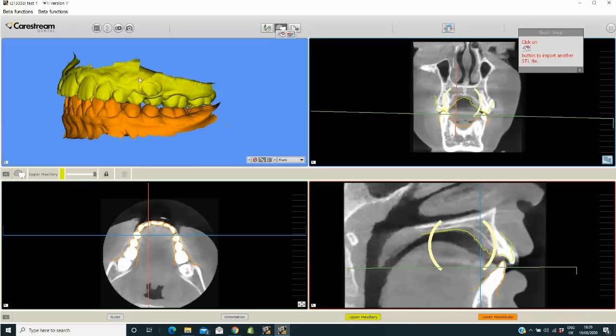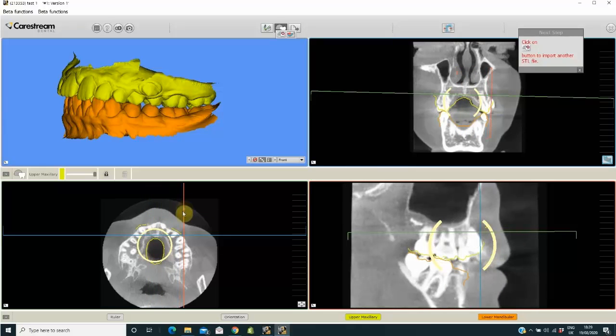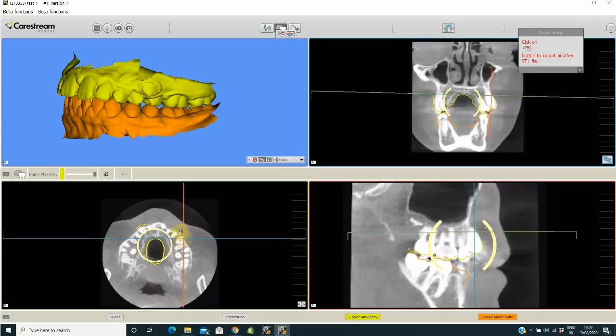When you refer a case to another doctor, you can add notes. In this example, a patient has an impacted canine, and you want to ask a colleague's opinion about whether you should align or remove it. To add a note, use the planes to look for the intersection point between all slices to make sure that you are putting the point in the right position.